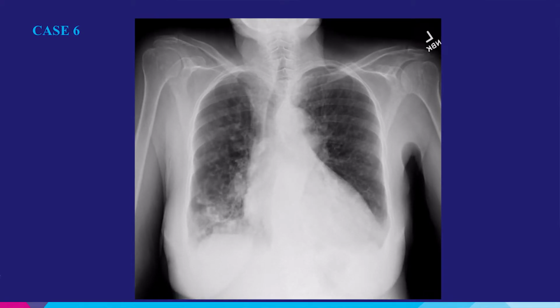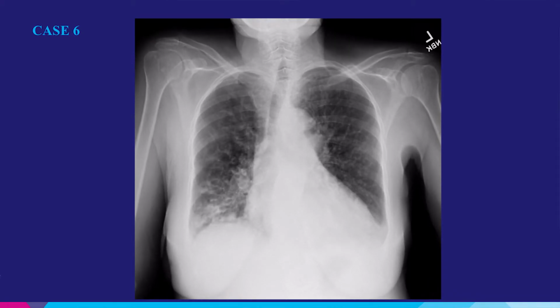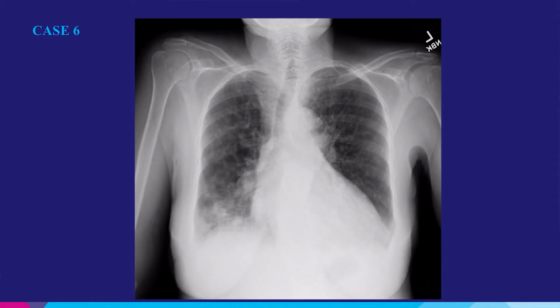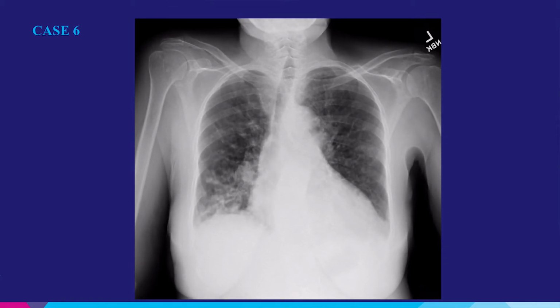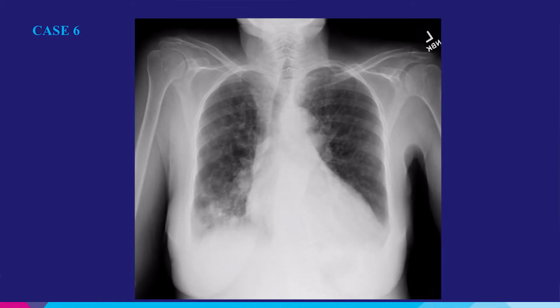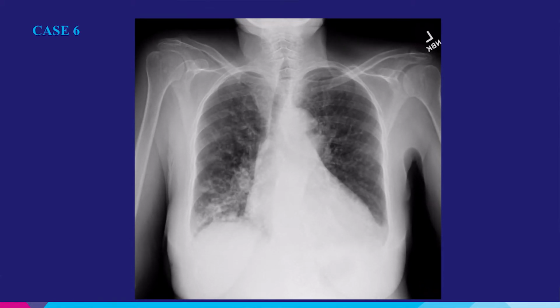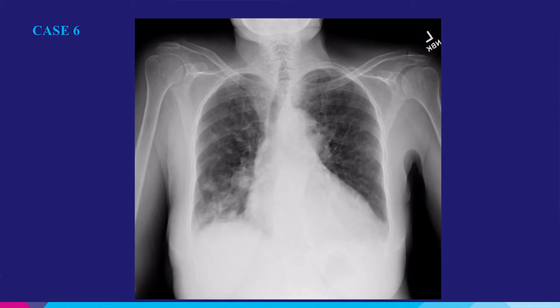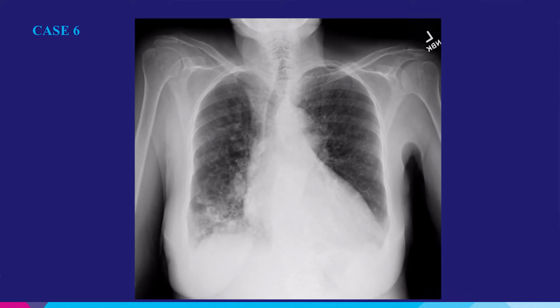Well, the thing is, if it is atelectasis, with lung movement, with inspiration, the atelectasis would go away. But here, what you see is that these opacities, they don't go away. They basically move with the lung parenchyma. So that raises the possibility. You can more definitively say this is parenchymal disease, this is pneumonia, or some parenchymal process going on.